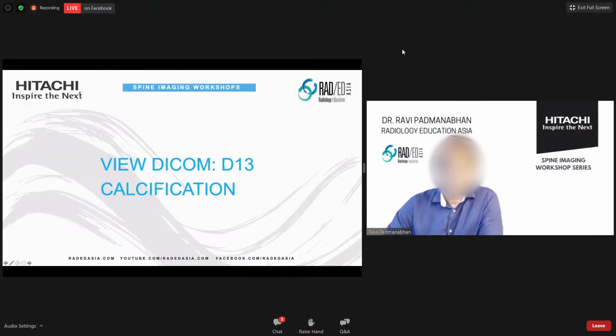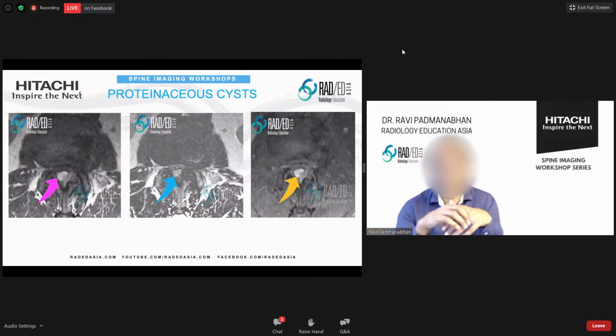Okay, so we've gone through that. And the last one we want to talk about is proteinaceous cysts. So all the cysts we've talked about so far are fluid, have got fluid within them. So they are high signal on T2.